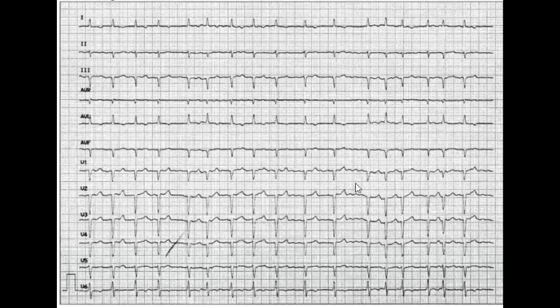Usually atrial flutter will always be regular. Okay, there are some exceptions, but in your booklet, it will always be regular. However, for example, for atrial fibrillation, if you see irregular QRS complexes, the action is irregular. Usually, 90% of the time, it's atrial fibrillation. And you can use this also for internal medicine, because sometimes the P waves are not even visible. You can't even tell if there's flutter or fibrillation. There's no P waves. There's nothing preceding the QRS, but you can see that the QRS action is very irregular.